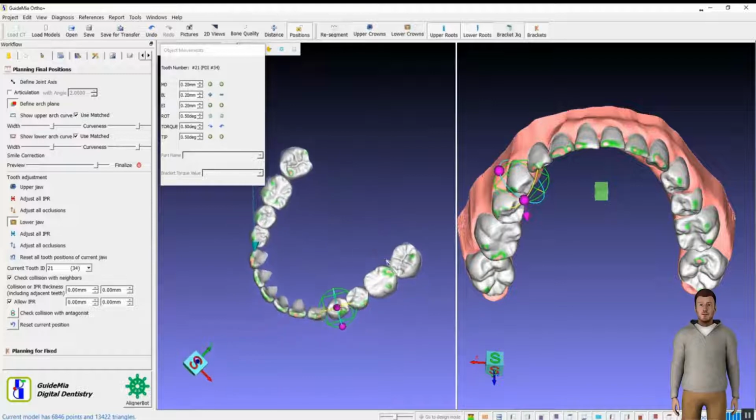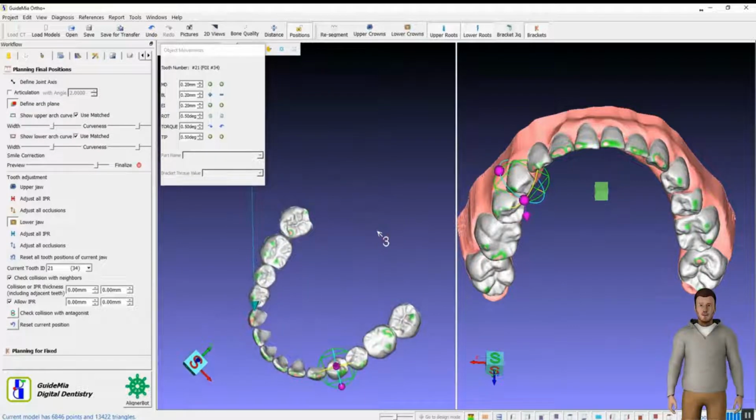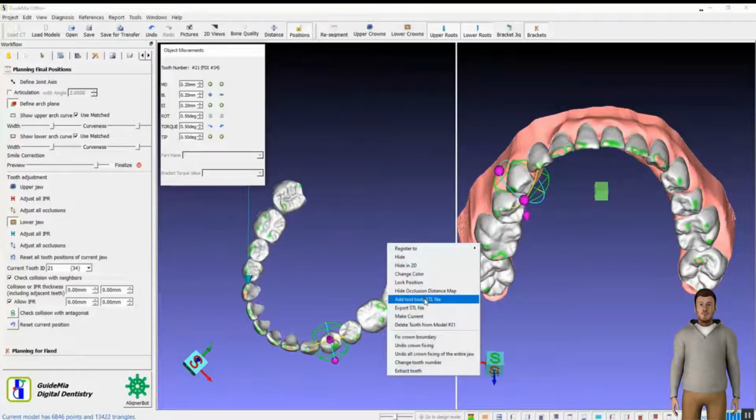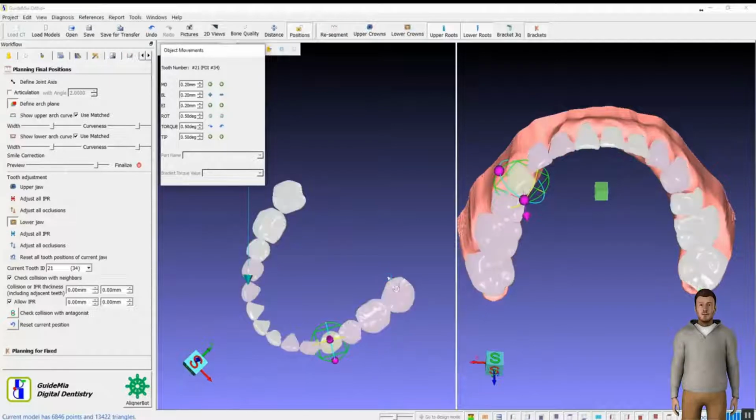As we know, it is typically suggested to be in a range of 0.2 mm. We can insert steps by right-clicking on any step of any tooth. We can then play back the movement. Visually check if there is a need to delay the movements for some teeth, and set a start step of any new tooth movement. There are many functions in this page.